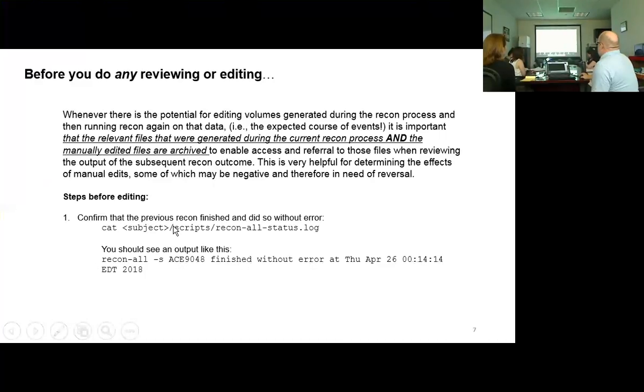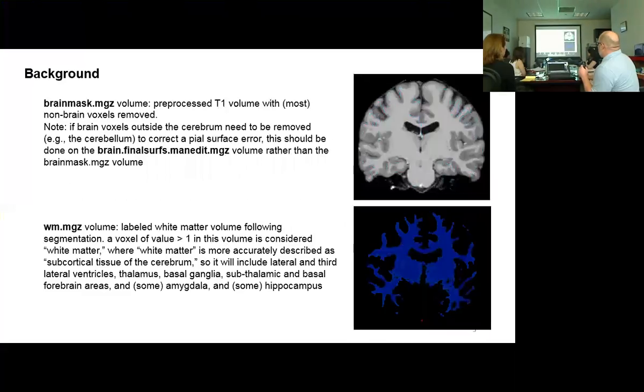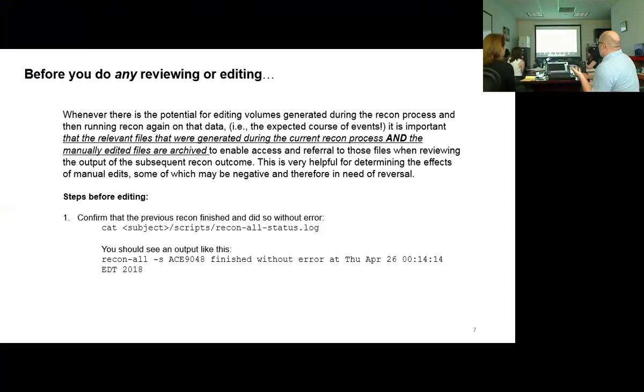Okay, so this is a quick aside, a protocol note. Before we do any reviewing or editing of data, so not just before editing but also just reviewing the scan, it's important that we make a copy of the files that we're going to look at. We're going to be looking at these 4 files, these volumes, and there will be a couple of other files that we'll look at.